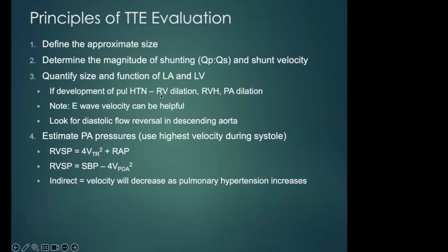Very, very similar to evaluation of VSDs. Again, you can get an RVSP from the difference in pressure gradient just using the systolic blood pressure.